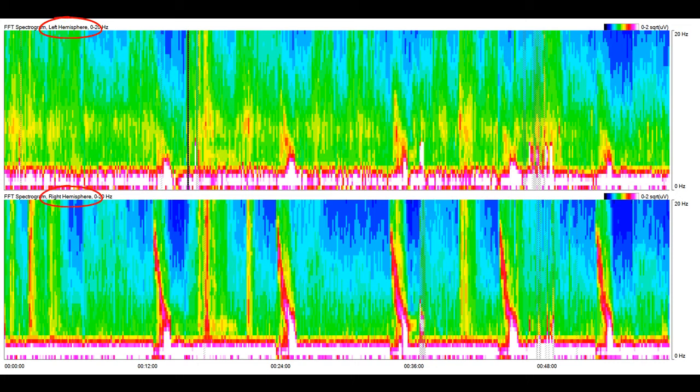Hemispheric averages are often a useful simplified representation of the EEG because most significant EEG changes involve at least a few channels in a hemisphere. Graphs that show hemispheric averages are usually good at depicting significant changes, while still allowing assessment for hemispheric asymmetries. These graphs also incorporate Persist's adaptive artifact rejection, which helps clear the trends of noise created by electrode artifacts, but that's a topic for another session.